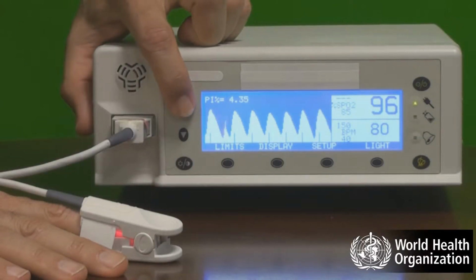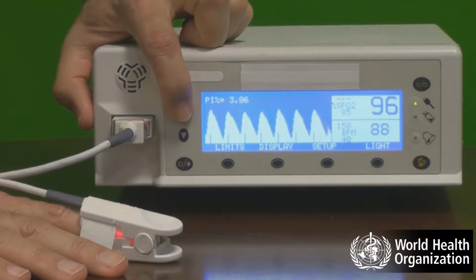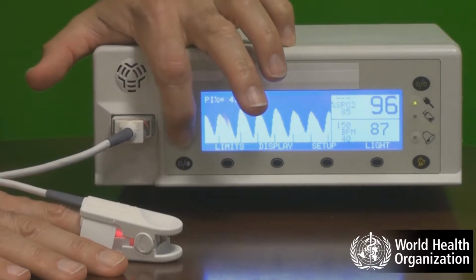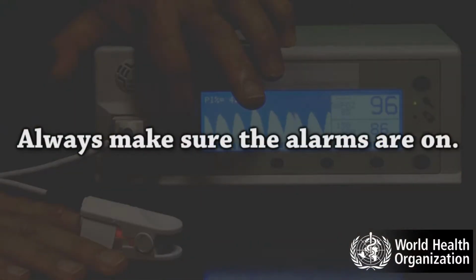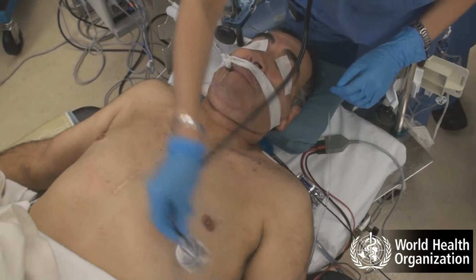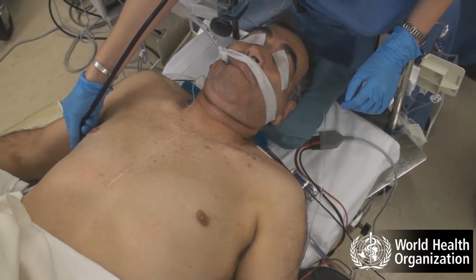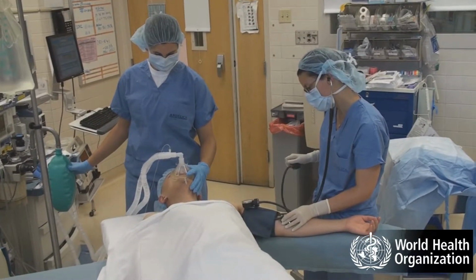Adjust the volume of the audible pulse beep to a comfortable level. Never use on silent. Always make sure the alarms are on. Like all machines, oximeters may occasionally give a false reading. If in doubt, rely on your clinical judgment rather than the machine.